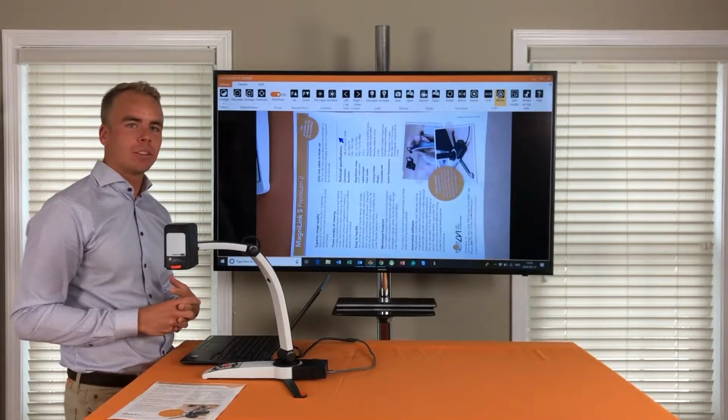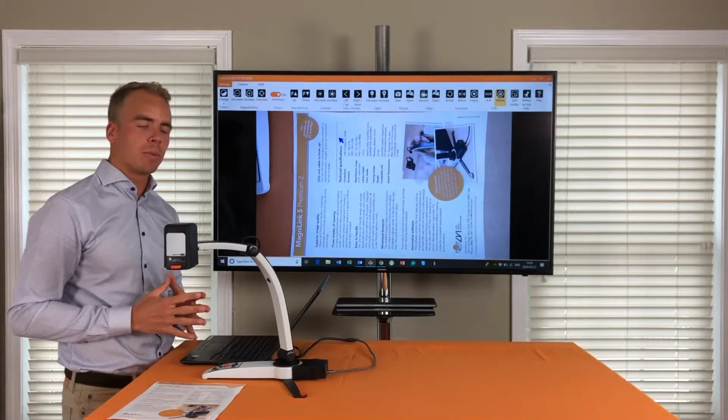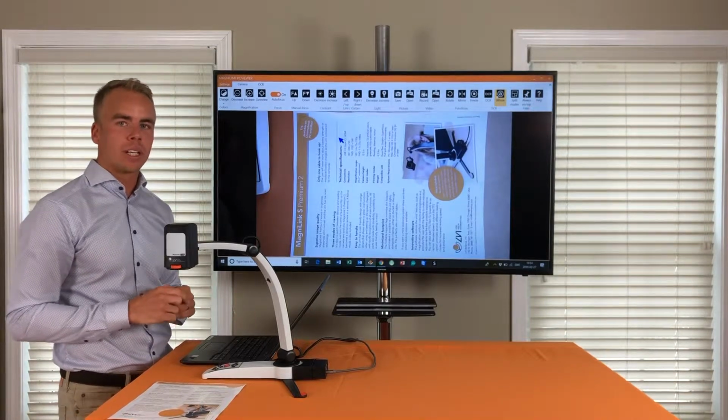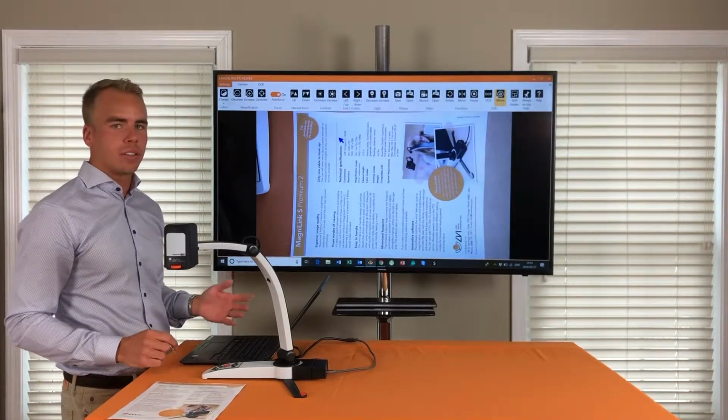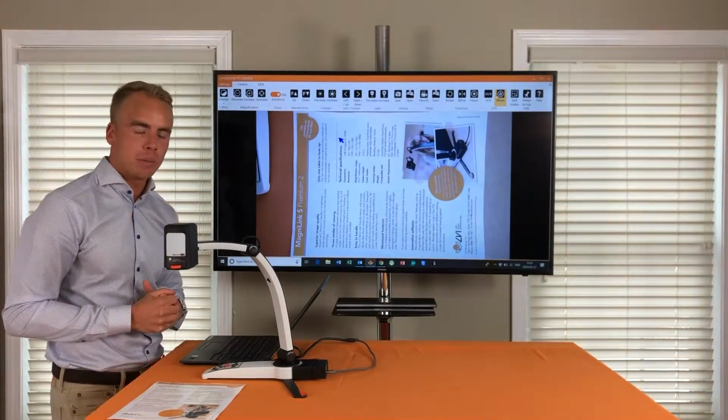In this video I'm going to show you the features and functions when using OCR text-to-speech with the MagniLink S Premium 2 connected to my PC laptop running the software PC Viewer, in this case also connected to this external monitor to give you a better view.